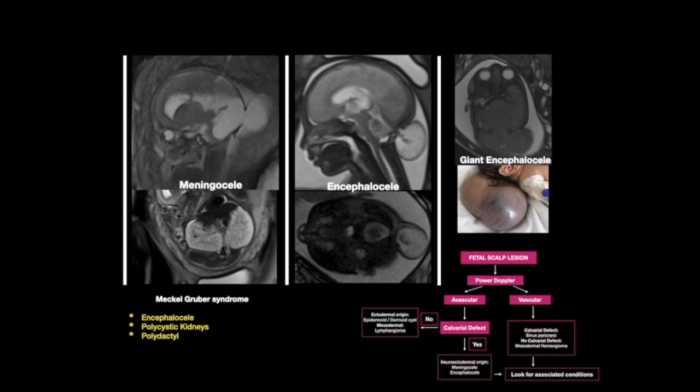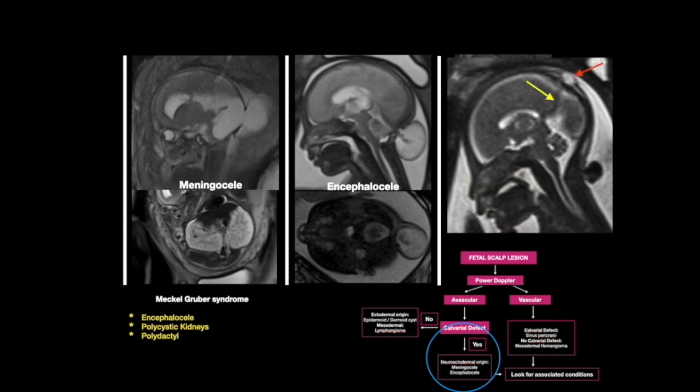Presence of intracranial communication in an avascular cystic scalp lesion points towards neuroectodermal lesions like meningocele or encephalocele. Evaluation of abnormalities of the venous sinus anatomy is very critical for the diagnosis of atretic cephalocele when you detect a midline cystic scalp lesion.